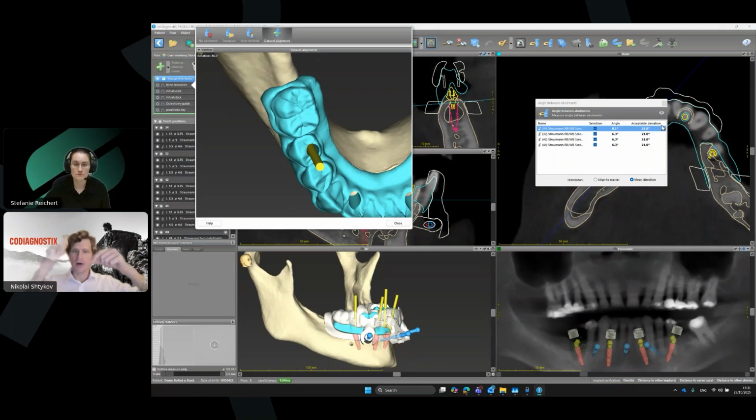So you put one coping inside, then you put the prosthetics with the cage, then you just fix it gently, then you unscrew, remove the prosthetics, put another one in the prosthetics, screw again, and when you do this one by one, it takes more time, but the benefit is that you will have small holes. So that's just because of this. If you don't want that, yeah, you can do this more easily, just with the big holes, and drop it.